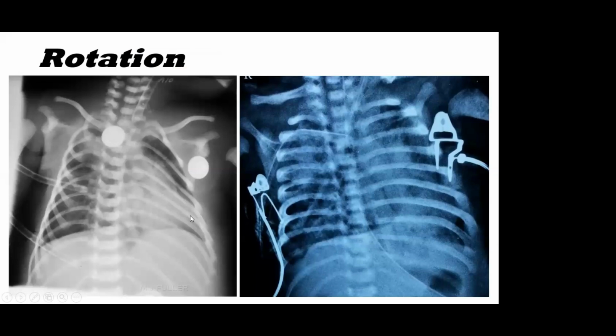Look at this heart. The left lung is hardly visualized. The right lung is more visualized. You can see the bronchovascular marking, and this part is also getting exposed. Here, the heart is hardly visualized, and if you trace the lung margin, you can see it crossing the mediastinum. So this is not an overexpanded lung.